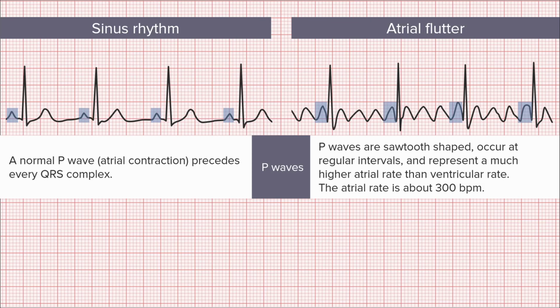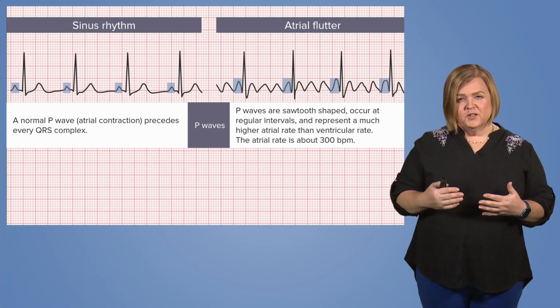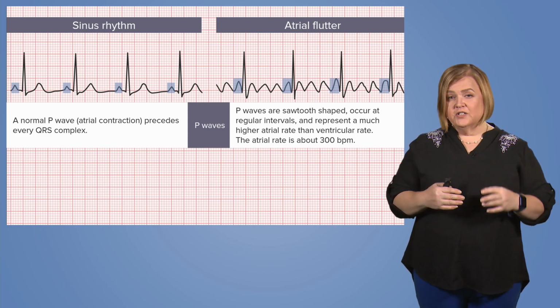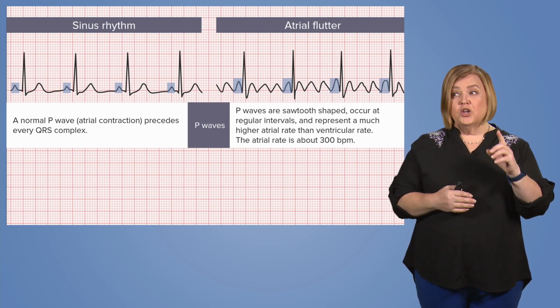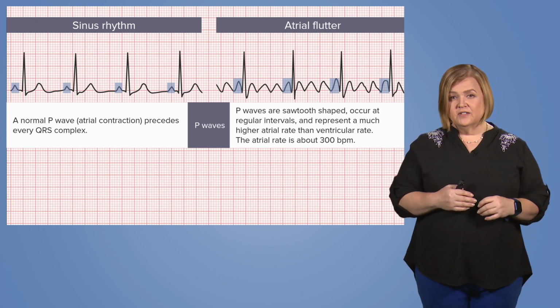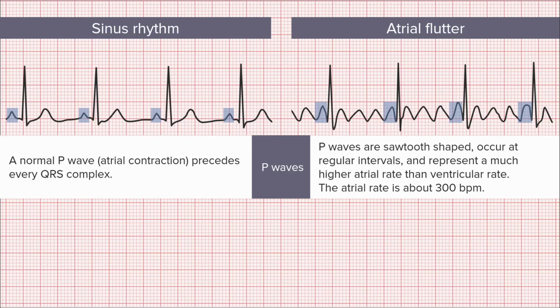Okay, why is that significant? I promise you, after practice and effort, when you look up at the monitor and see those sawtooth waves, you're going to know what rhythm your patient is experiencing. Patients don't tend to stay in this very long. They either convert back to sinus rhythm or they could devolve into atrial fibrillation. So keep that in mind, but this has a very distinctive look.